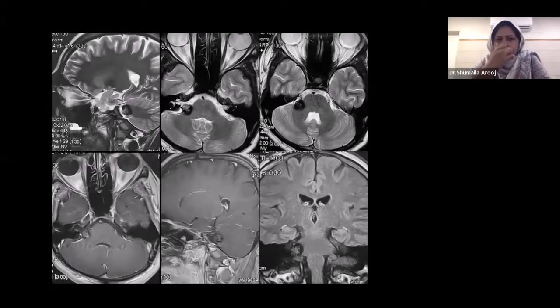This was another interesting young patient. He presented to our neurology clinic, and the neurologist sent me the scans, and the patient had significant tinnitus and a ringing sound in the right ear, and he was an office worker.